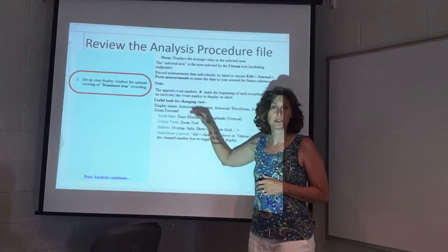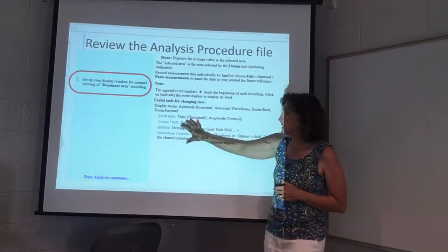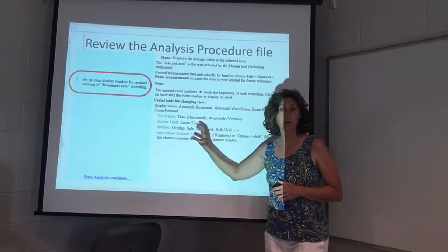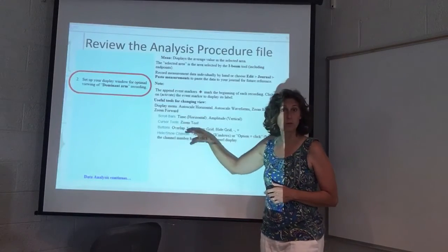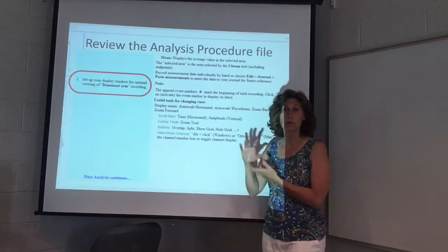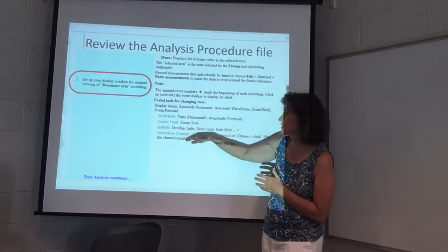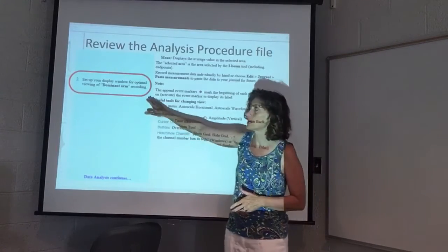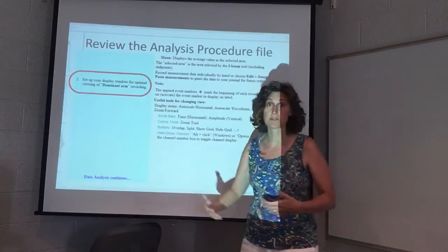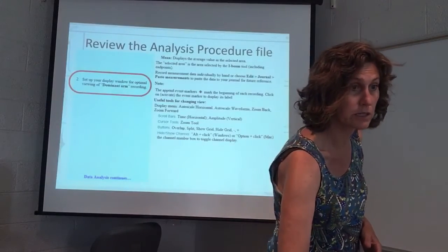Overall, that's the goal, and then from there, this first section is going to introduce again the tools. If you've watched the introduction to the software video that I made, you don't necessarily need to read through these. That's what I talked about, and I hopefully showed it to you more visually than just the words that are here. So this is all setting you up. This is telling you what you're going to get ready to do for this first stage of the analysis procedure.